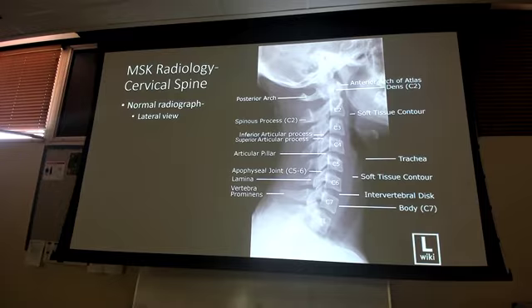So now, if I were going to try to count and say, tell me which vertebra is C4, what's going to be your landmark for starting? Not T1. And here's why not T1. This is a really good cervical spine x-ray, to the point where they did a great job getting the patient to depress the shoulders to be able to get C7 and all of T1.